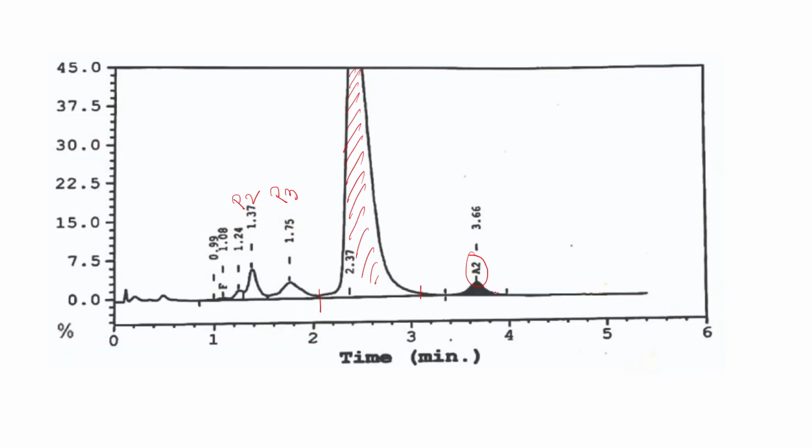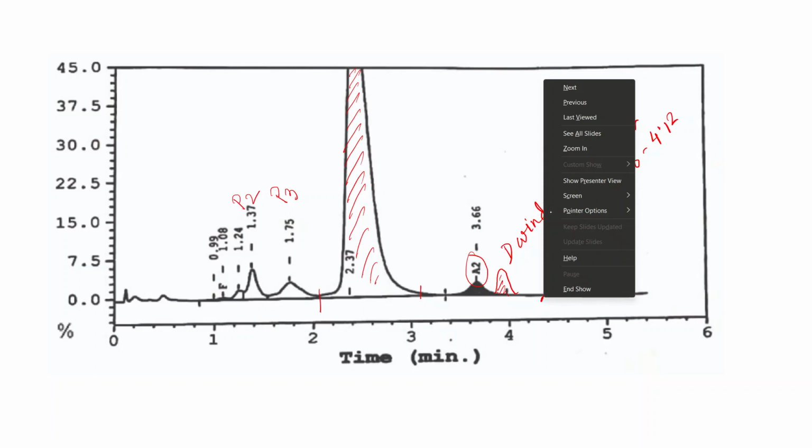After HbA2, just adjacent to it, we can get a D window. In a normal person, we won't get it, but in an abnormal hemoglobin variant, like in the presence of HbD Punjab, we can get a peak here. The retention time of this D window is 4.05 minutes and the retention window can vary from 3.98 to 4.12. Followed by that, there will be the S window, for HbS. It will come between 4 minutes and 5 minutes, and the exact retention time is 4.27 and the window is 4.12 to 4.43, somewhere like this.